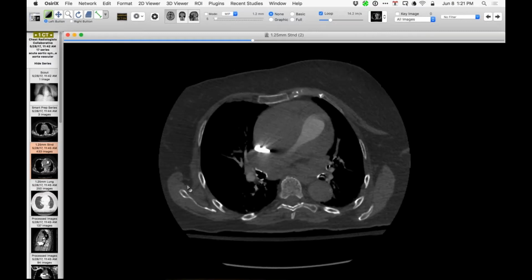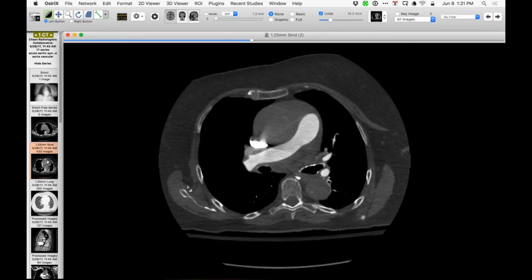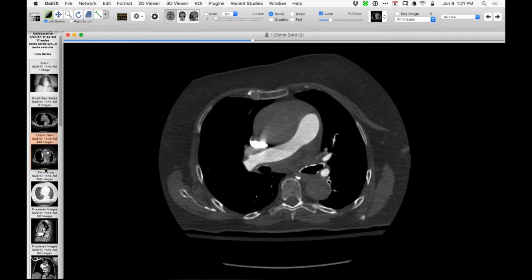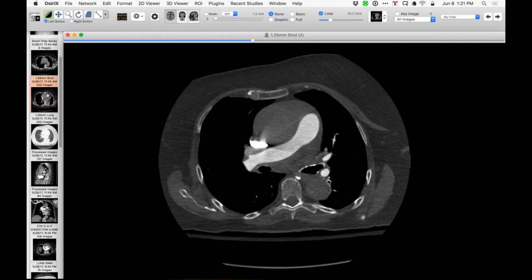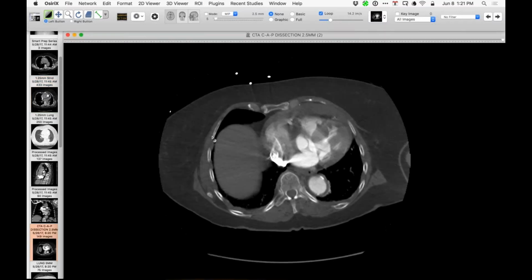But about here, particularly about, yeah, that image there is a finding related to the pulmonary artery. That's interesting. So I guess that they diagnosed no PE, and I presume they let her go, but then she was very symptomatic and was imaged again later in the same day, but at a different hospital. So that's in the morning or close to noon, and then she gets a CTA around 8:20, right?